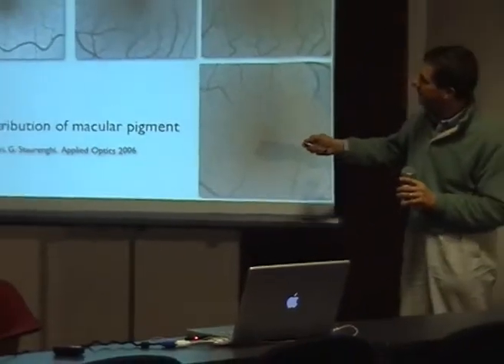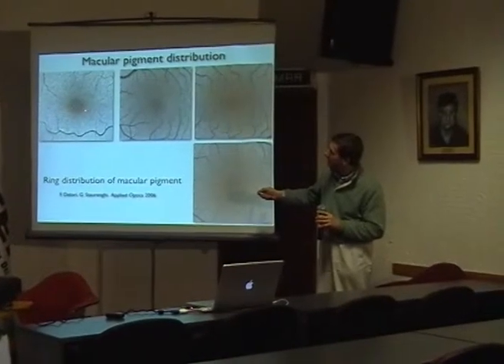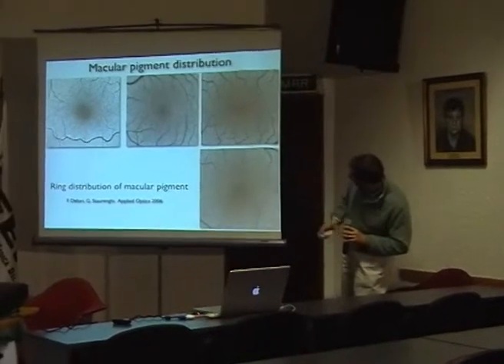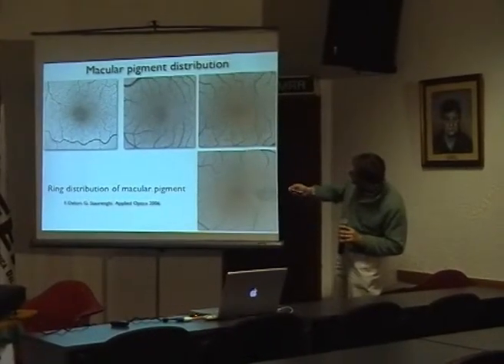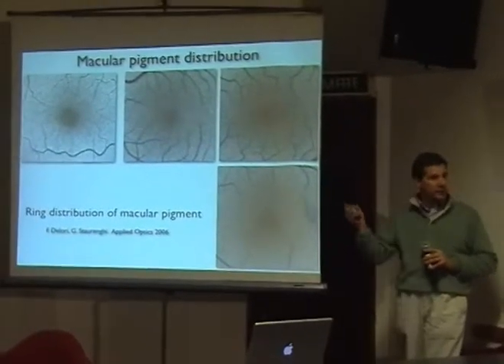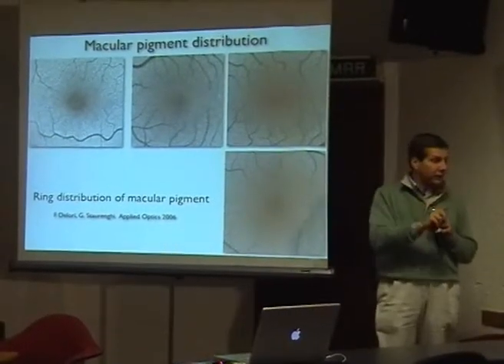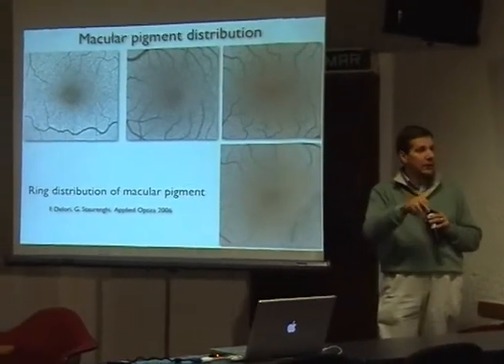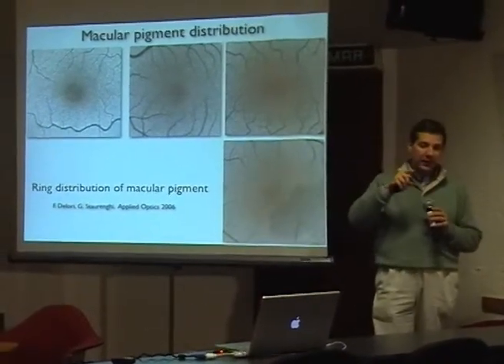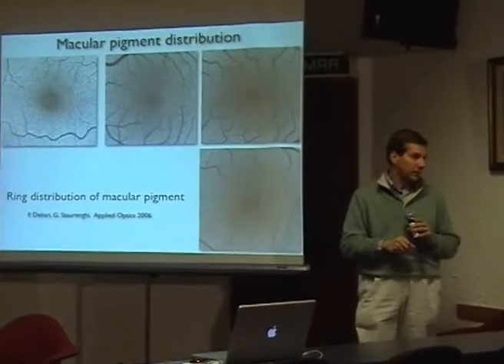You see this, the annular autofluorescence here, that is a female. And these are males, and here there is almost no macular pigment. An interesting situation is in juxtafoveal telangiectasia, type 2A by definition, and both patients have no macular pigment.